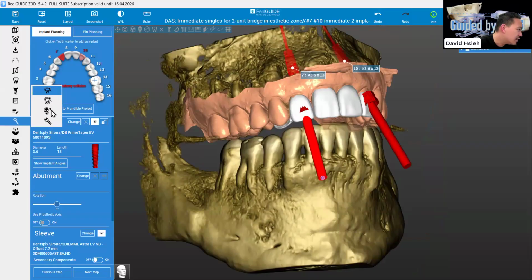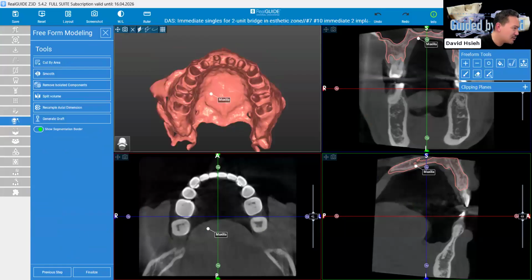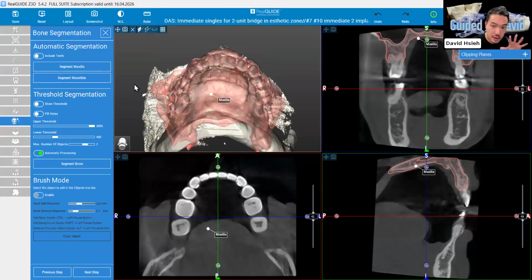The first one we're gonna do is the bone right here. In the past, generating a bone was so hard, and the root is so close. Oh, I already generated one, but yeah, we can go back. So basically how you generate segmentation for the bone is you just hit segmentation.